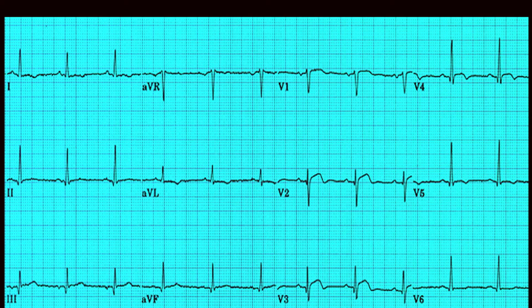So in this ECG you see there is a normal sinus rhythm, the P wave is good looking, and there is a QRS following the P wave, and it's occurring regularly. There are no abnormal P waves in between, and if there were abnormal P waves, we'll assess them. Most usually they are ectopics, atrial ectopics, supraventricular ectopics. So heart rate is around 75 beats per minute, and it's a normal sinus rhythm.